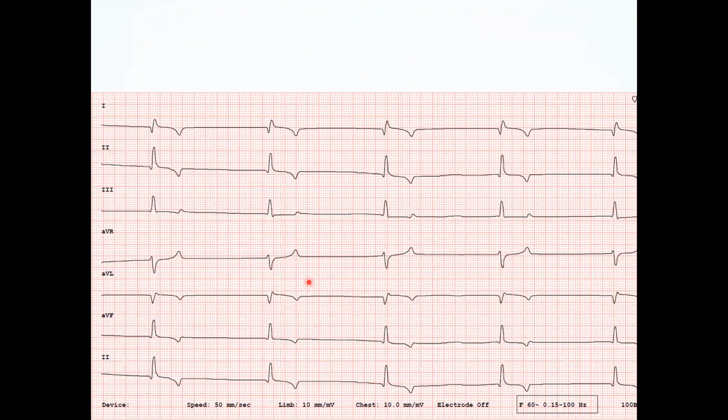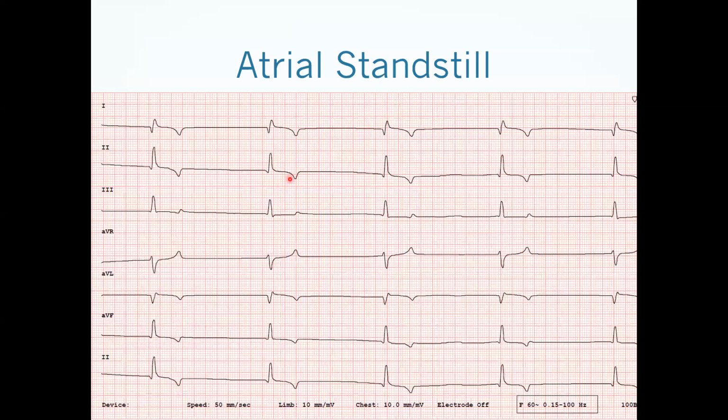So kind of coming around full circle to where we started, we now have an example here of atrial standstill. So now we have QRS complexes, okay, and we've got our T waves, but we have no clear P waves. But we still seem to have these QRS complexes at a nice regular rate, almost like the sinus node is still firing. Remember, the sinus node we're not going to see on ECG, so it is still firing in these examples. Okay. So can anybody think of causes for atrial standstill in the chat?